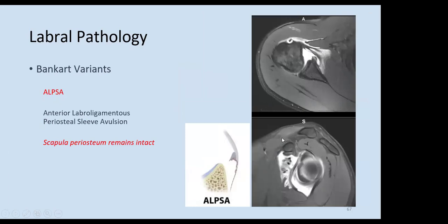So that's an ALPSA, as you can see here. That's an ALPSA lesion with medialization of the labral fragment.